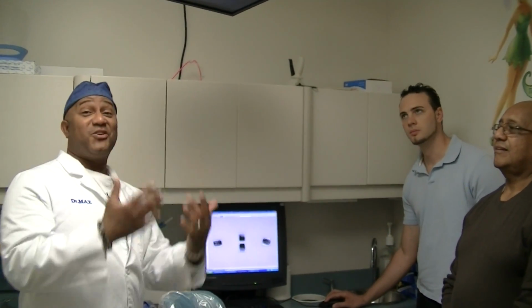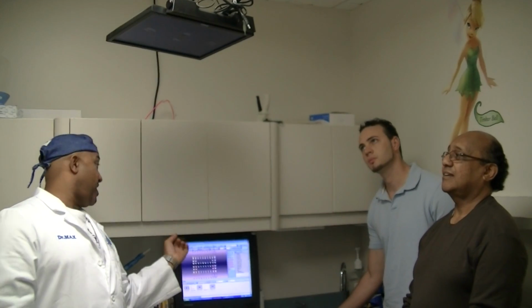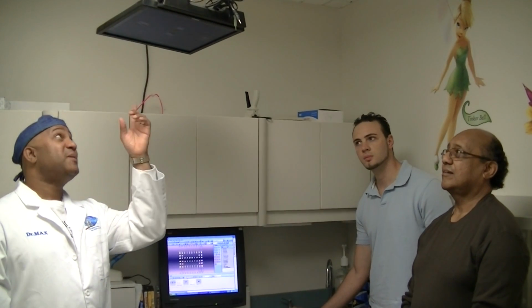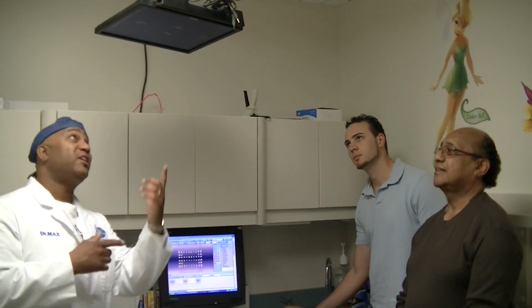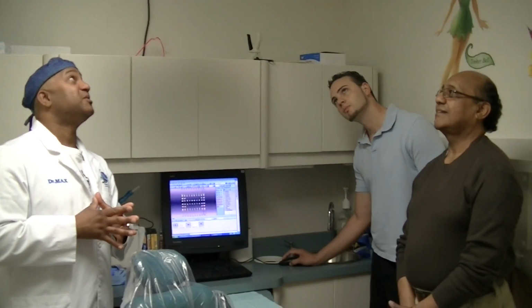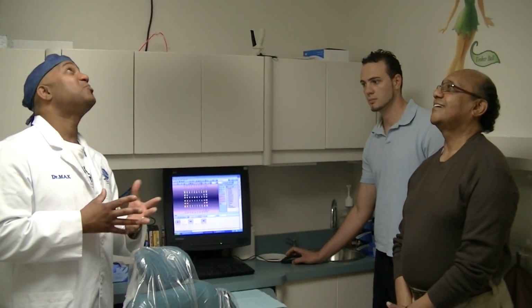We have another monitor that they can just sit there and look up at, and here we are. We can actually move a piece of the software. It's integrated, so we can just slide it over, and then we can have it viewed there. We can point out, using our cursor or the mouse, different areas that we want to bring attention to and to educate them about their health condition. So it's pretty neat software.